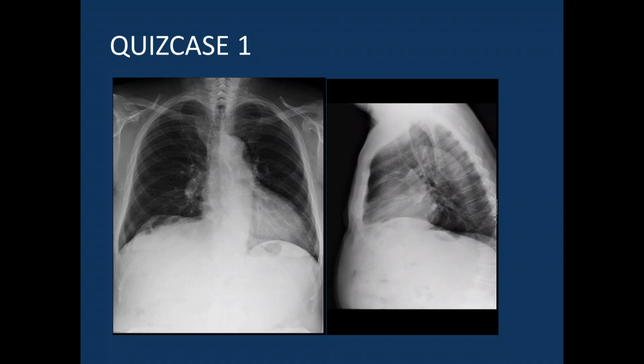For example, a hernia, or a liver cyst, or a lesion of the right superior lobe near the superior vena cava, hepatomegaly, and the last idea is the Chilaiditi syndrome. I like these colleagues who have so good contributions in our chat.